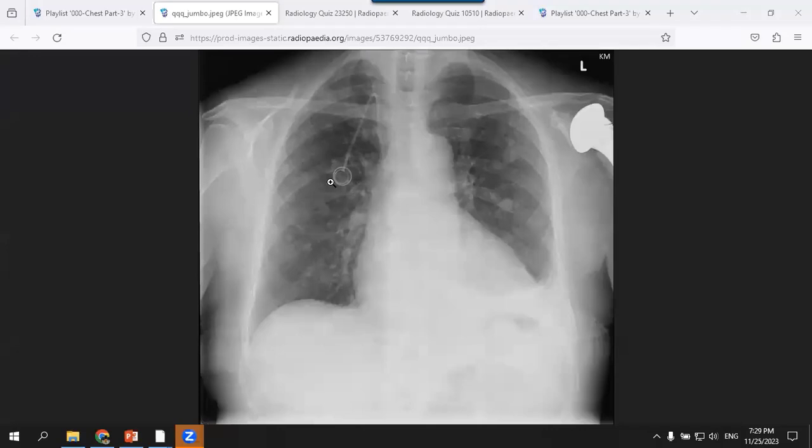Portacath or tunneled venous line. Maybe portacath, maybe Hickman line, maybe Broviac cath, whatever. It will represent a clue in the exam case. In young age, we think, what is the cause? Maybe cystic fibrosis with long-term antibiotics. Also maybe sickle cell disease. We comment on the bones, on the spleen, on the surgical clips.